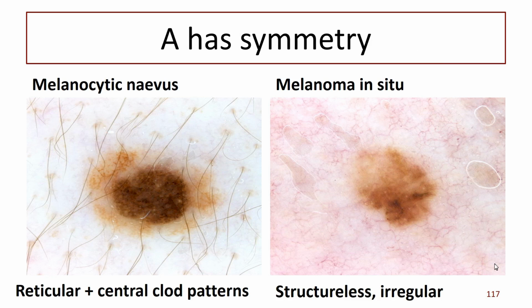So can you describe this for us, Mystery? No, this one here? Because you've already told me about this one. Tell me about this one. Well, I thought it was a reticular pattern, but more pigmented in certain parts and less pigmented in some other. Yes, so a melanoma can certainly have a reticular pattern, but we've lost our symmetry.